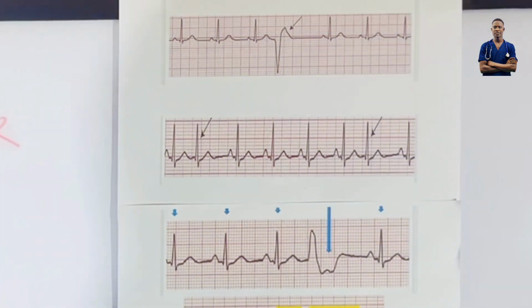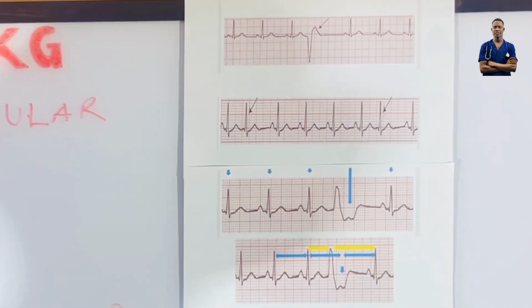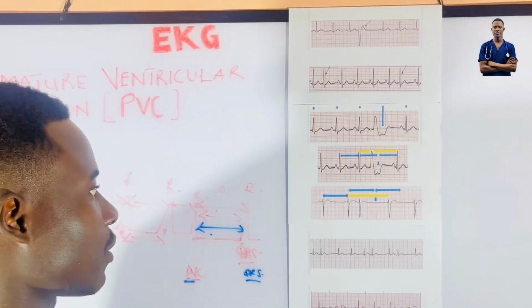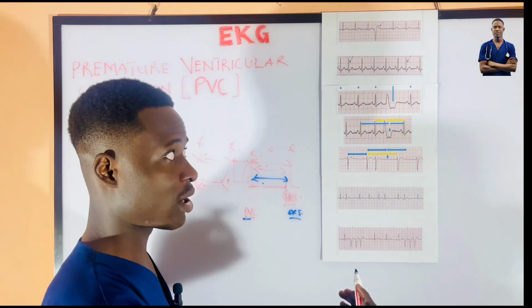That means the heart was trying to compensate for the ventricular contraction so that the sinus node can work, and we get a sinus rhythm. Are you clear with it? Now, so this is basically how it is.